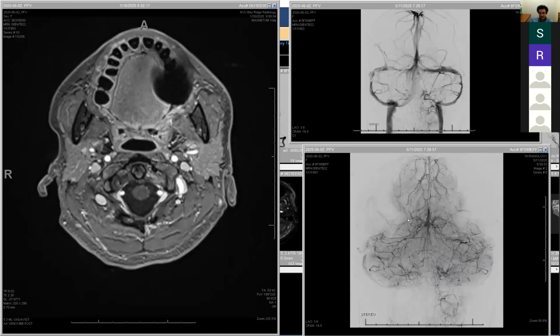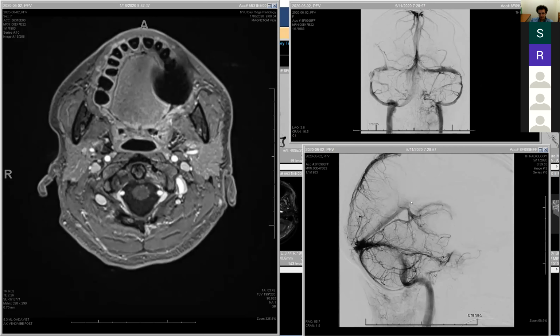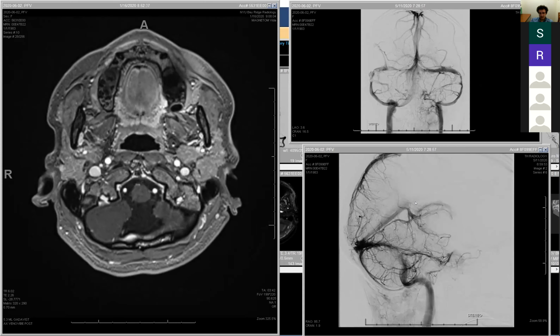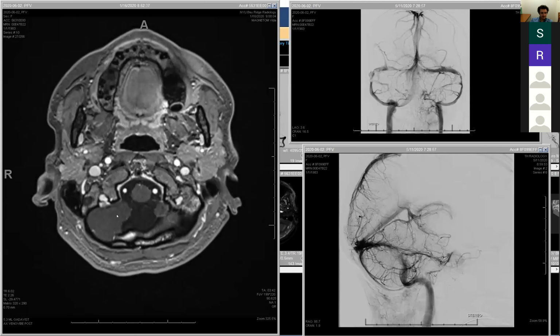So here's the venous phase in the lateral view. What do we have here? In this individual, we have a big occipital sinus, right? So here and here is the occipital sinus. And like this sinus, the occipital sinus also is very flat, so you see how it's faint but wide in this view, and narrow in this view. The occipital sinus is right there.